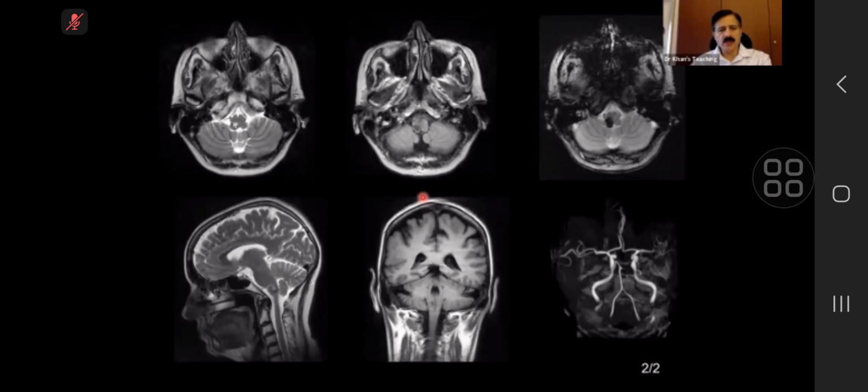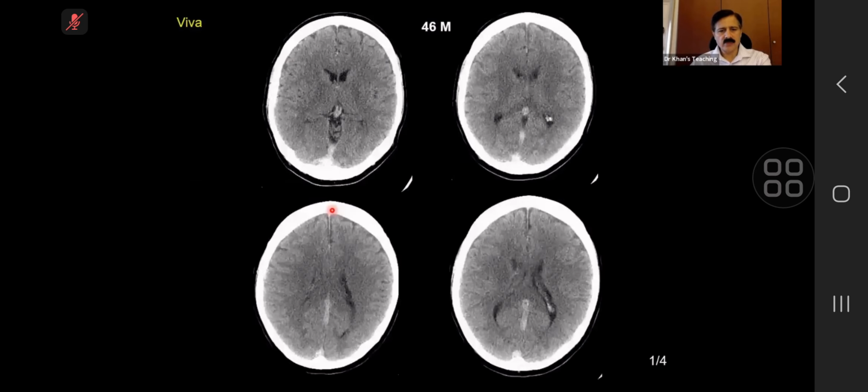And when you do a T2-weighted MR for this, the examiner will ask, what will you do? I will do an MR. And on MR, you can see this susceptibility weighted image. Actually, on this T2, you can see sort of that popcorn type of appearance. And you can see it here also. So this is another cavernoma.